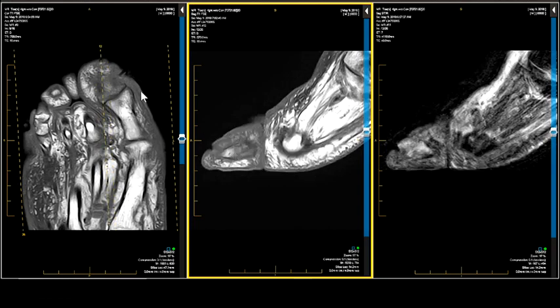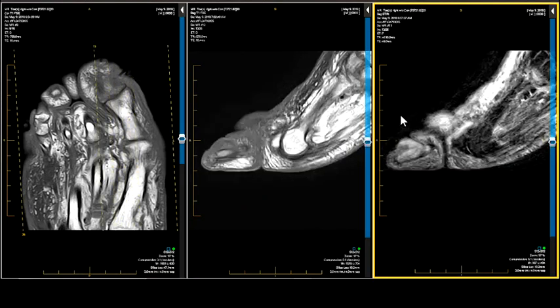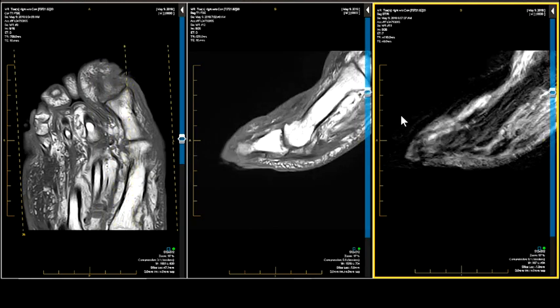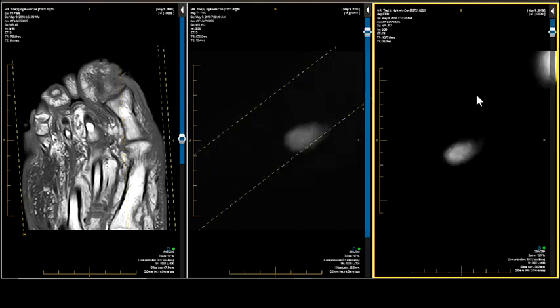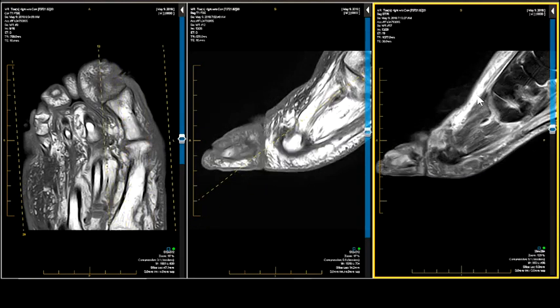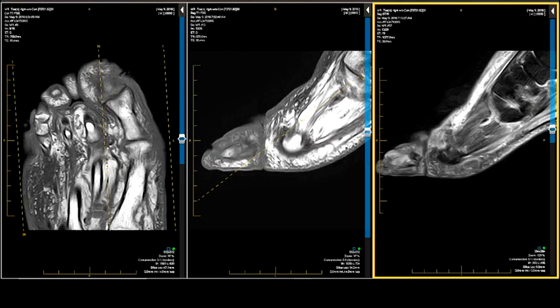Now, we're not done yet, because they got to know, where do I cut? You got to amputate that. So is there involvement of the phalanx proximal to it? Now, granted, the patient moved all over the place, and I apologize for that. I think we have one that's a little less motion affected. Oh, look at that toe. The vanishing toe. Hyperintense on the water-weighted image.